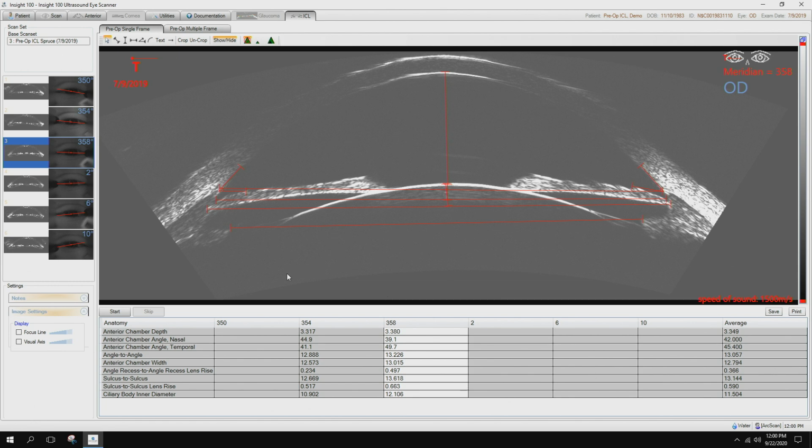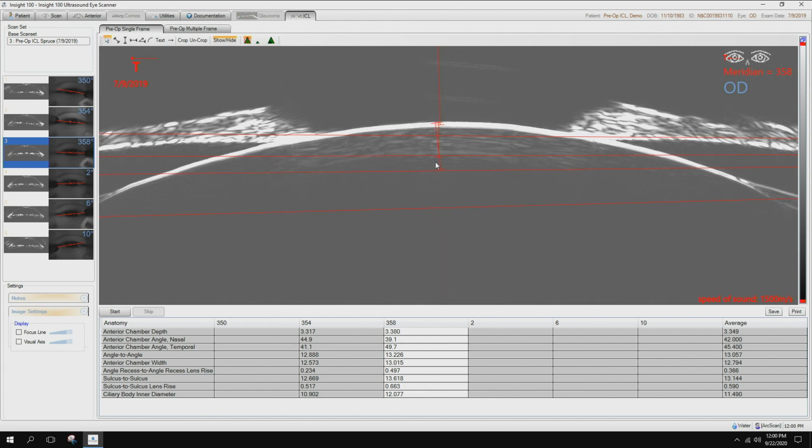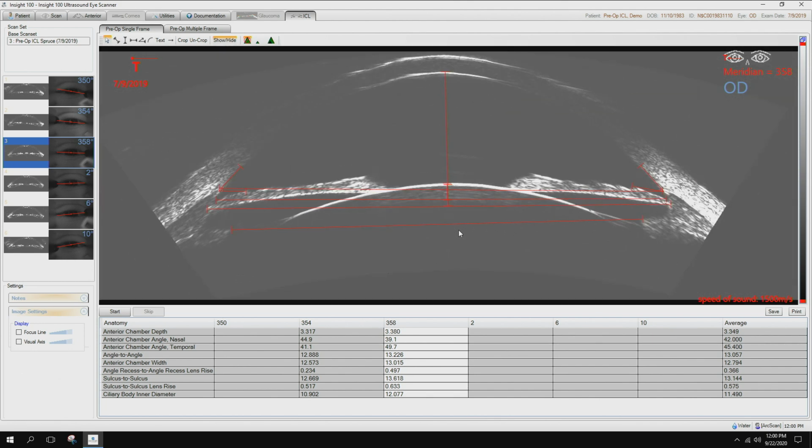Once I've gone through each of these and filled out the entire list, if I choose to make a change, maybe I don't feel it is right, I can move the cursor. Once it turns to an X, I can grab that and move it to where it needs to be to edit that. Once I let go, it has changed that value in the table below. The wheel in the middle, you can zoom in. So if I wanted to touch these and move them just ever so slightly, again, we made a change. Zoom back out. Everything is calculated there. We're good to go for the next.